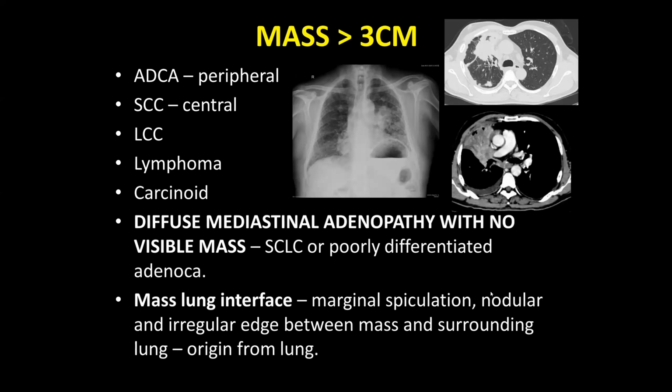Right. So you can see that here there is a lobulated lesion. Here also multiple nodes are there. So this could either be squamous or an adenocarcinoma. This came as poorly differentiated carcinoma. This is a peripheral adenocarcinoma. You can see that septal thickening and multiple nodules are also there, especially this lobulated nodular pleural thickening that is more common with an adenocarcinoma.